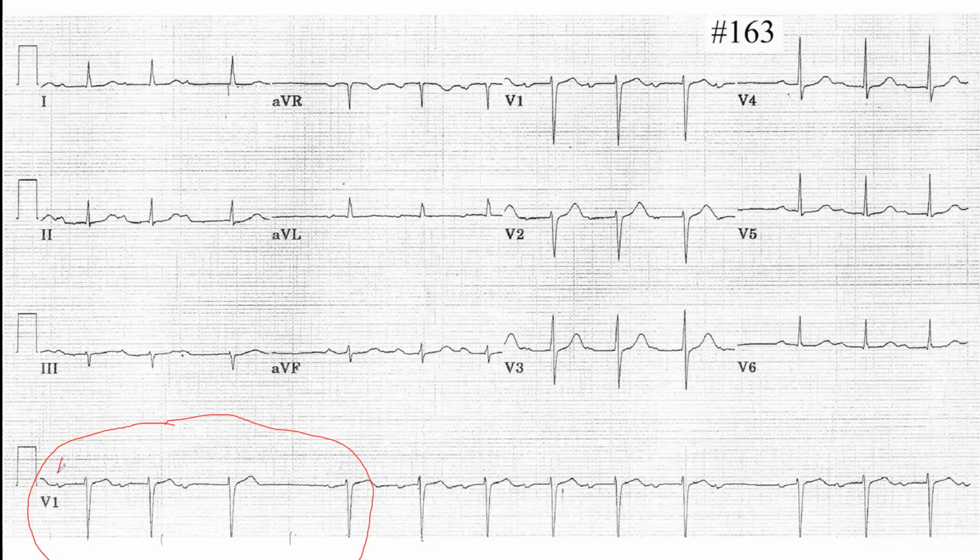Okay, look at that, that's a P wave. That's a P wave. It's different. The next P is coming here. Now, let's compare this PR, because that was the last conducted PR.